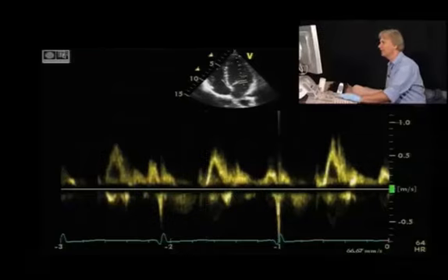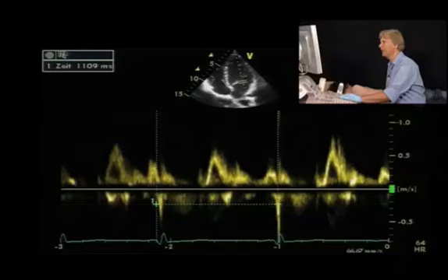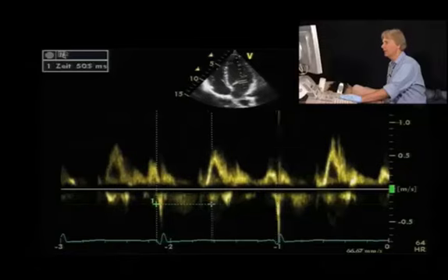The next thing we can do is look at the duration of systole and the duration of the heart cycle. So we can relate the duration of diastole percent-wise to the duration of the heart cycle. How much percent of the heart cycle is diastole? In our case, you can see that our patient is far above 50% of diastolic filling percentage.